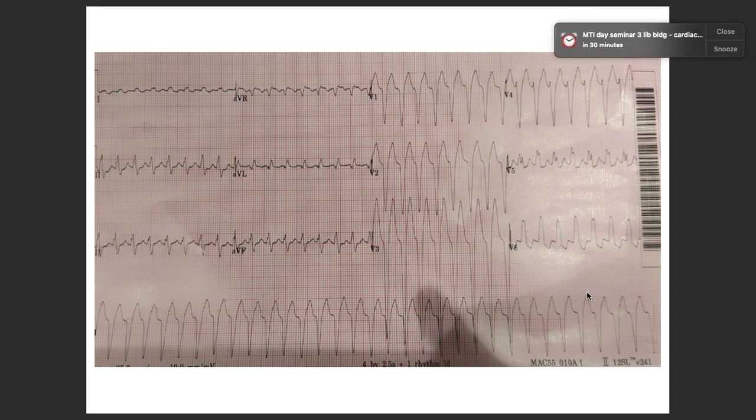So this is going to be the tricky case for which I am going to ask for an explanation at the end of our session. So in the meantime, I'll keep on giving you those inputs and all. Okay, at the end, I will expect an answer. So in this as well, what do you see? Just now, some definitions and all. And I asked it, and I did something for the patient. I did something, okay? Some magic.